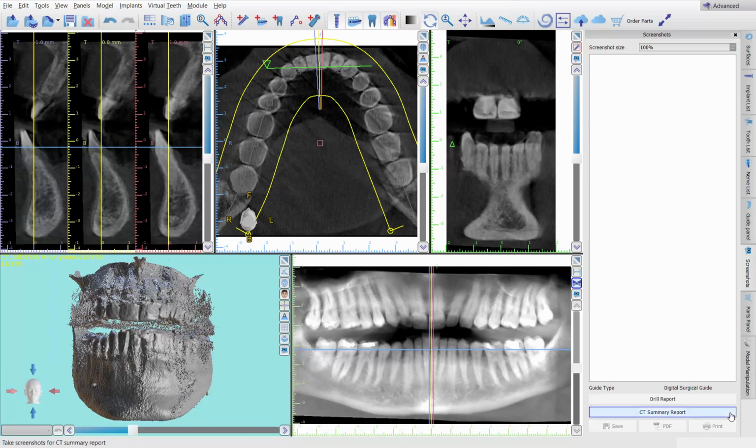I just want to make a very quick video, hopefully very quick. It's just honestly to answer a question that's come up a few times, and I guess I've not done a great job of answering this in previous videos. So I'm going to show you how, after you've brought in the model you're planning to treat on, to bring in the opposing model, and how to bring it in occlusion. I know that sometimes is confusing.